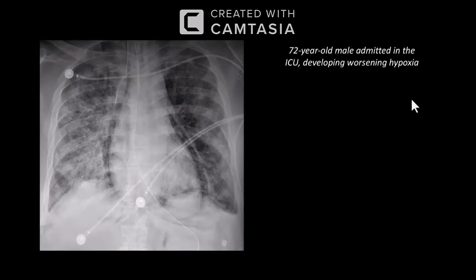Looking at the bones, they appear normal. Cardiac outline appears normal. So in summary, this is a case of pneumomediastinum, with lung changes suggestive of acute respiratory distress syndrome. So I will immediately convey my finding to the referring physician.